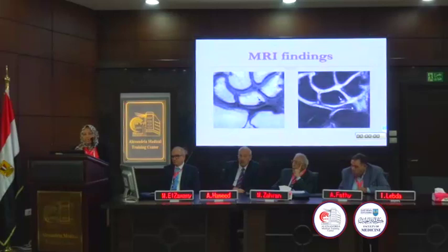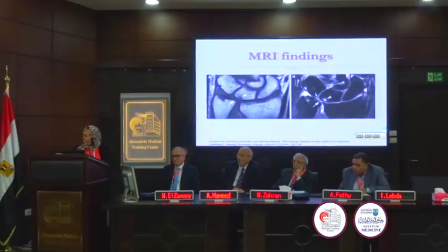And only this subtle finding or only this minimal finding is enough to suggest that there is an early ongoing process of ulnar abutment syndrome. Another more advanced case here, we find that there is chondromalacia. Chondromalacia is identified by the irregularity of the articular cartilage at the ulnar side of the lunate, related subchondral cystic and edematous marrow changes, central tear of triangular fibrocartilage, and partial tear of the lunotriquetral ligament, and this is the full spectrum of the ulnar abutment syndrome.